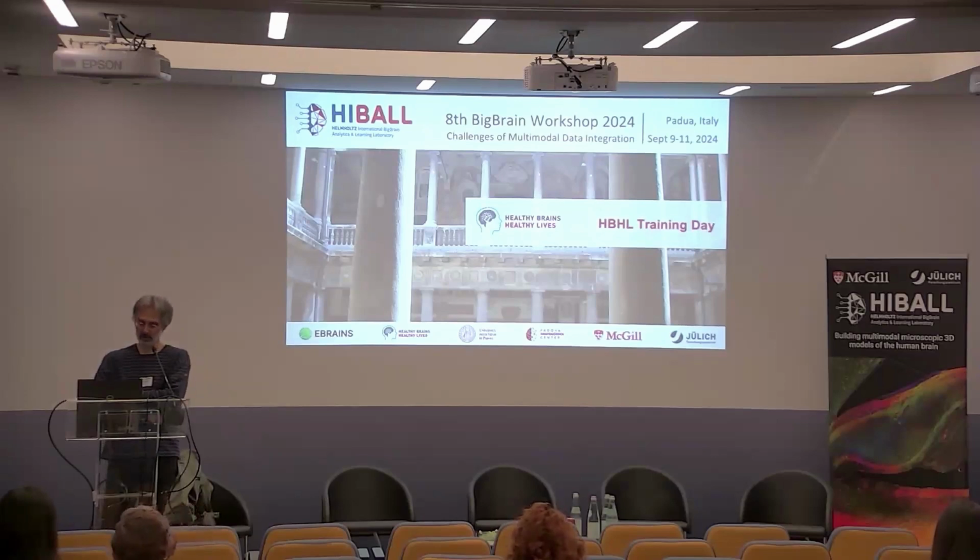And in the toolboxes in BrainVisa, there's a little toolbox to make a bridge between FreeSurfer and Morphologist. It's able to import the segmentations of FreeSurfer, write them in the Morphologist database, and then extract the sulci. So if FreeSurfer succeeds where Morphologist fails, then you can still extract the sulci. But there's no guarantee that in the lesional region, everything will be okay.